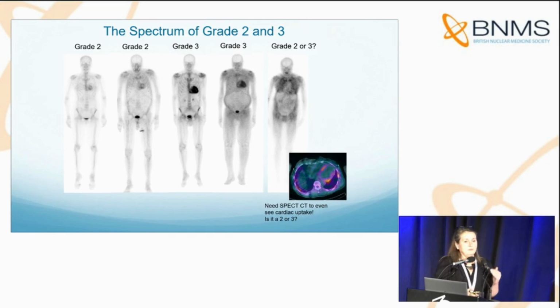So as I said before, grade 2 and grade 3, a bit of a spectrum, personal interpretation, sometimes quite difficult to decide, is this really a grade 2 or is this pushing into grade 3 territory? I have to say, in terms of practicalities, it doesn't really make much of a difference whether it's grade 2 or grade 3, so don't get too worried and too hung up about that. The difference is between a grade 1 and a grade 2, and I'll go into that later.